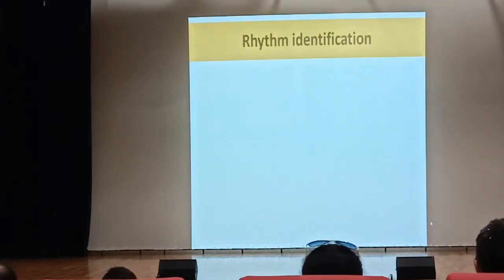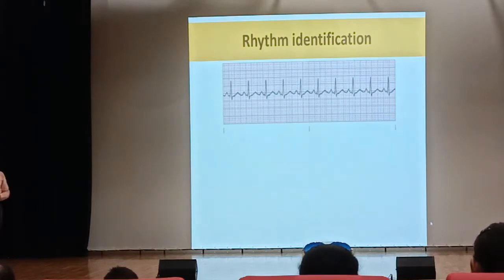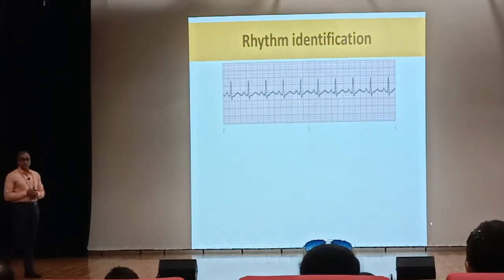So how do we identify the rhythm? Let's take one by one. Anybody interested, you can take the mic and identify this rhythm. Anybody?